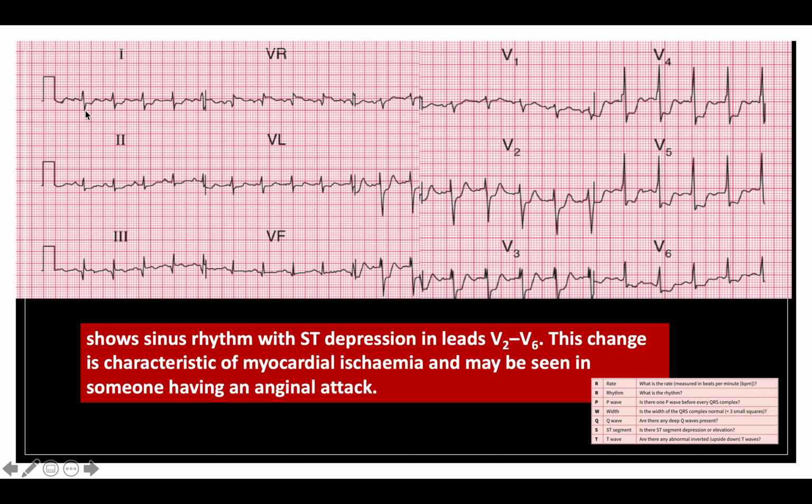The QRS complex we've identified as very short, as in it's even less than 0.12, i.e. 120 milliseconds, which normally is 3 small square boxes. In our case, only 2. So this patient is tachycardic. There is really rapid firing. Now, when the QRS complex is narrow like this, it can represent ischemia or some sort of heart failure, because the heart is trying to pump out as much blood as possible to the ischemic area within the heart or into another body part. The patient might be hypoxic, in various different regions, but overall there is some sort of tachycardic event going on. Now, the Q wave: are there any pathological Q waves?